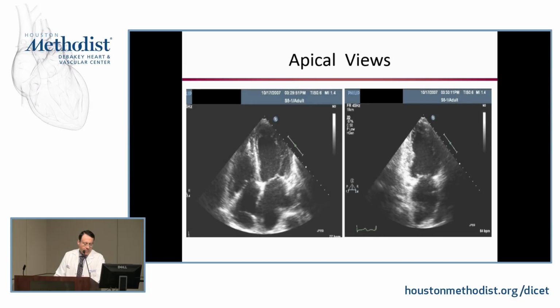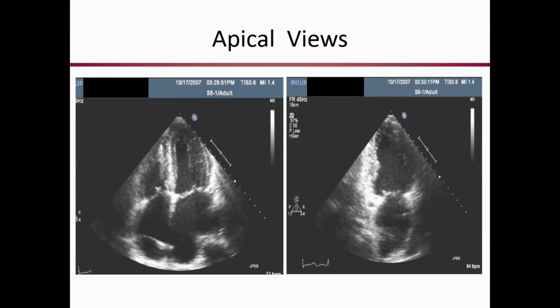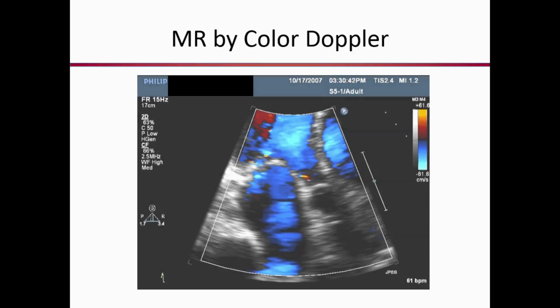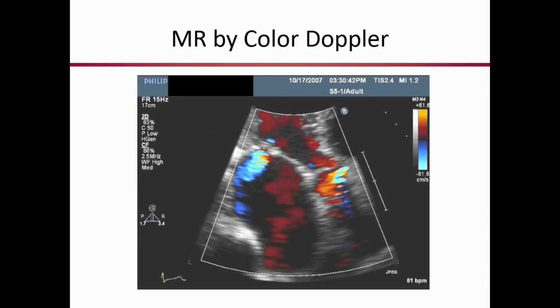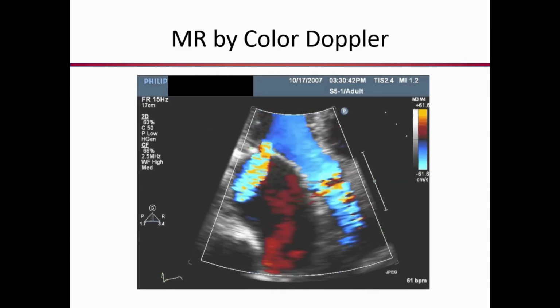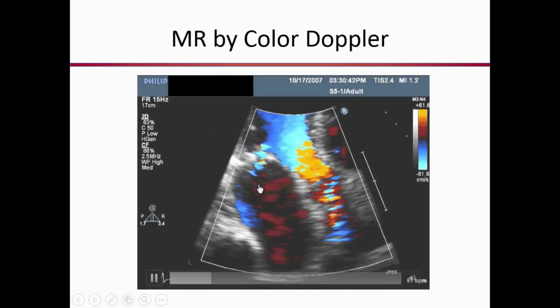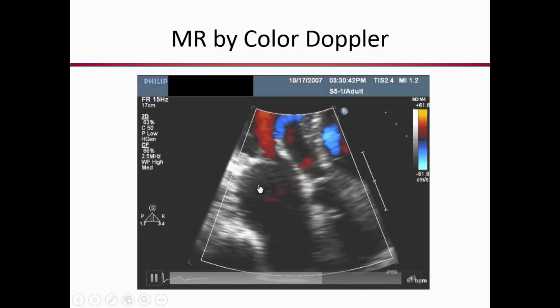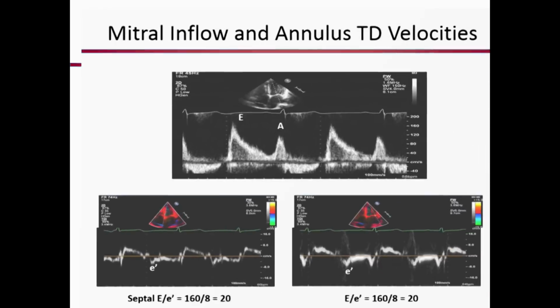When we look at the apical views, apical 4 and apical 2, you have pretty big atria, but LV volumes look normal. The LV ejection fraction looks normal. We want to look at regurgitant lesions because regurgitation can affect the mitral E velocity, can affect the decel time, and so on. And not much of a regurg there in terms of aortic or mitral. Clearly you want multiple views. It is not just this view, but I chose this for the sake of time.